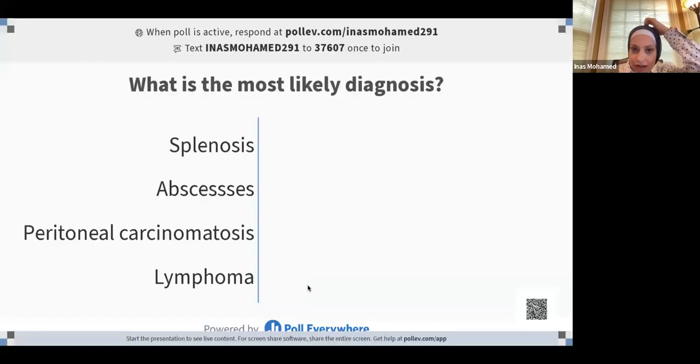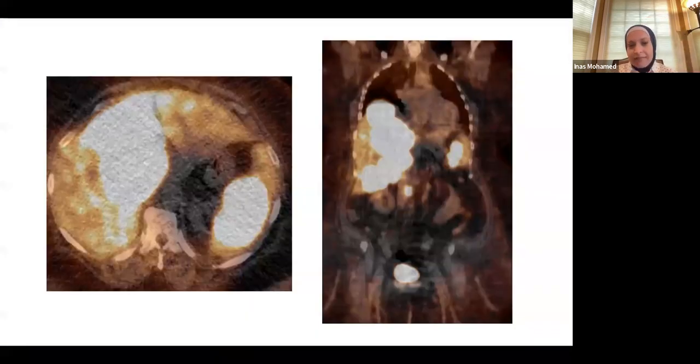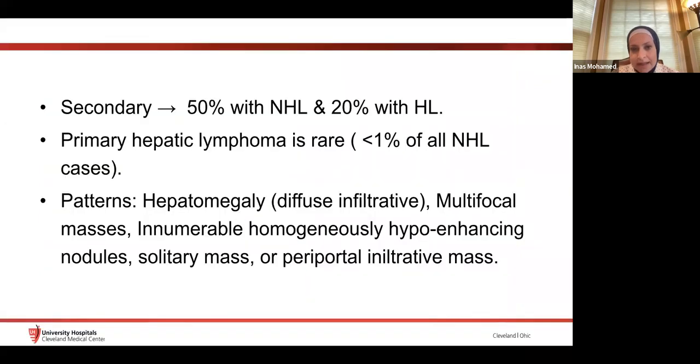So this was actually lymphoma, and I want to show you the PET CT for this case. Crazy, just crazy. FDG avid PET CT is beautiful in cases of lymphoma. Look at all this activity, and this patient also had some lymphadenopathy, which would help with the diagnosis. But again, if there's cancer, you will have lymphadenopathy. But the spleen was kind of an add-on. Made it easy.